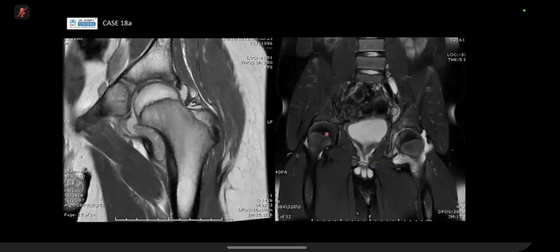The interesting thing here is there's not much in the way of marrow edema, and this would, of course, be correlated with clinical history, although sometimes it can be hard because, as I said, systemic JIA can have fever and raised ESR, CRP and so on. But septic arthritis is going to be really painful. With an acute flare of JIA, juvenile inflammatory arthritis, people can still carry on, they are not in excruciating pain. So it can be grumbling for quite a while, and then it's incidentally picked up.